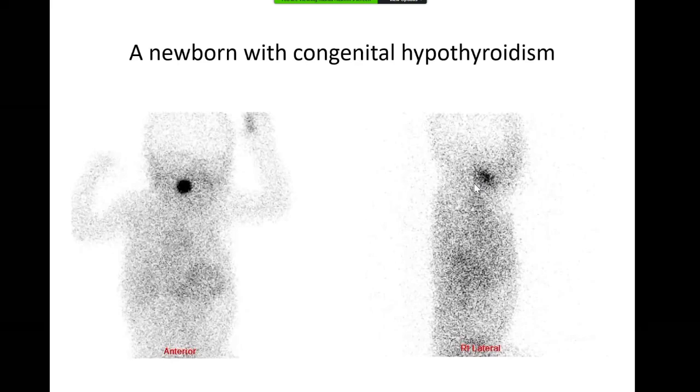And the key here is the lateral view. It's very difficult to keep the baby extended, and to work out where is the neck. It's difficult, but on the lateral view, you probably can make out the outline of the head, the face, and this narrow neck, and then the thorax starting. So this is a lingual thyroid. Right, sir.